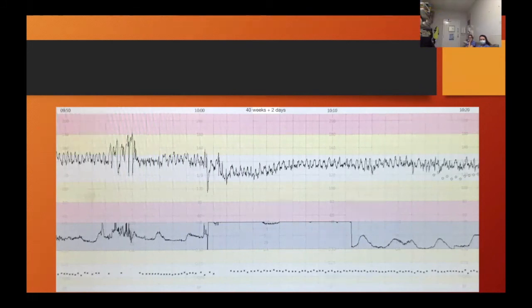Okay, so we're getting more and more of this sawtooth. Sawtooth we sometimes link with baby bleeding. But baseline remains stable. Stan seems to be completely fine still. If not, this would definitely be the time to think about tocolysing. But the problem now is she was 8 centimetres and then 8 centimetres again. The first instinct would be to start Syntocinon.